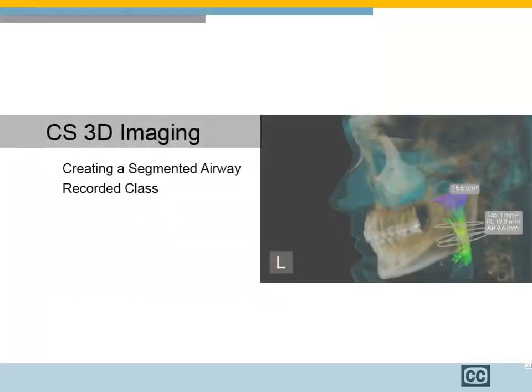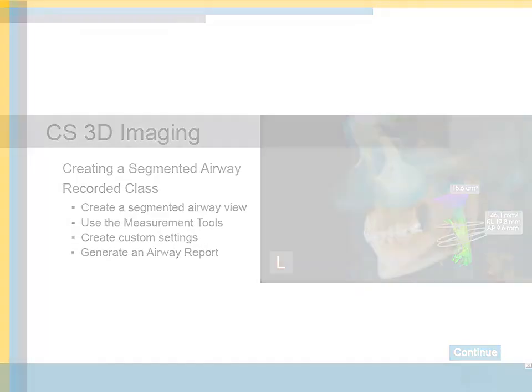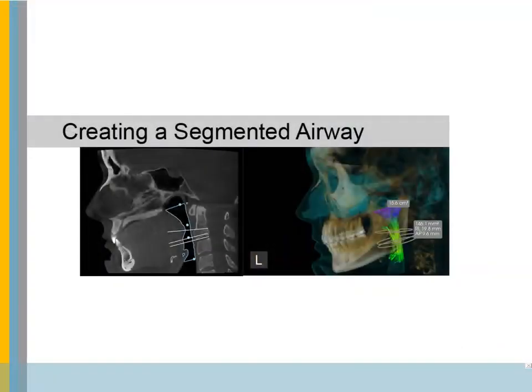CS3D Imaging, creating a segmented airway recorded class. This recorded class is designed for ENT, sleep apnea, and orthodontic team members. It provides the workflow to create a segmented airway view with distance and volumetric measurements. Creating a segmented airway.